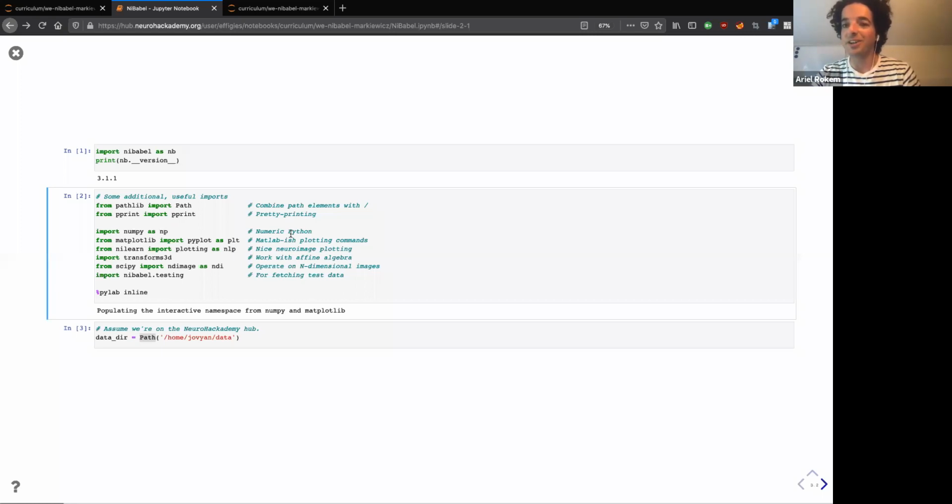More generally, going over how to install software is maybe out of scope for this particular presentation, but we can add a little bit of documentation to the materials that talks about how to install all the various things. I hope that answers that question. That was just supposed to be demonstrative in case you're working in a different environment. Right now, that's not something that we need to work on here. I'm sorry if I gave any confusion there.